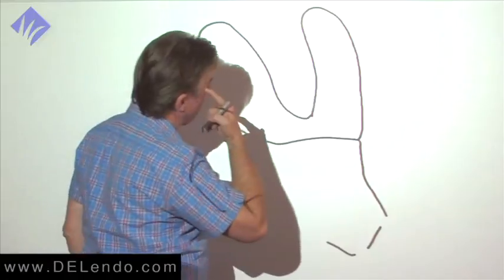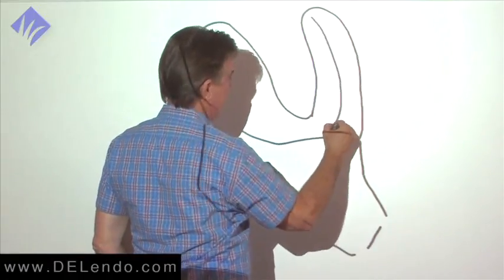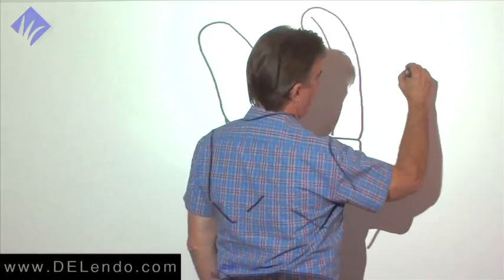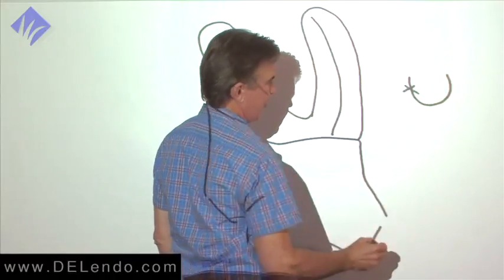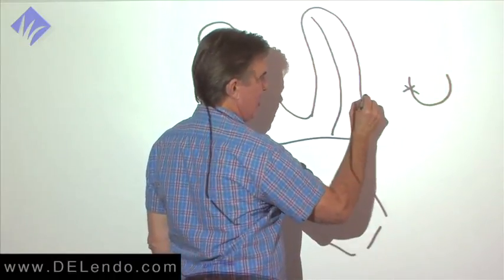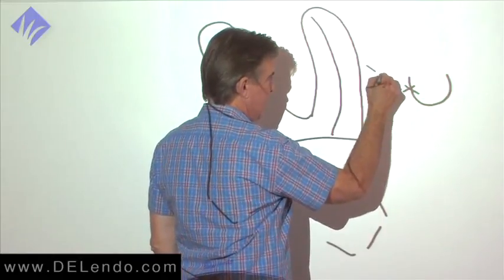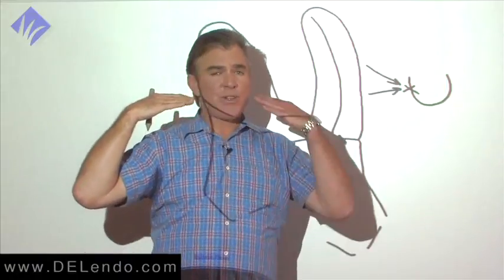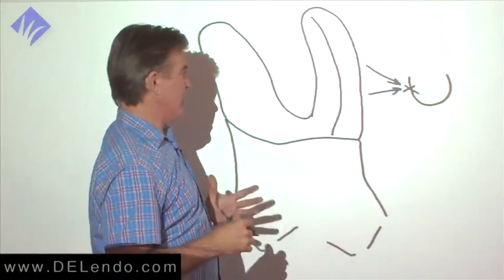Okay. And we put a file in here and we take the shallow distal view. So if this is our patient's jaw, here's the tooth we're concerned with. We're going to take our straight on view like this, and we're going to take our shallow distal angle like this. It's got to be kind of a bite wing. It's got to be horizontal to the occlusal plane. If it's up at all, it's going to foreshorten and show us less.